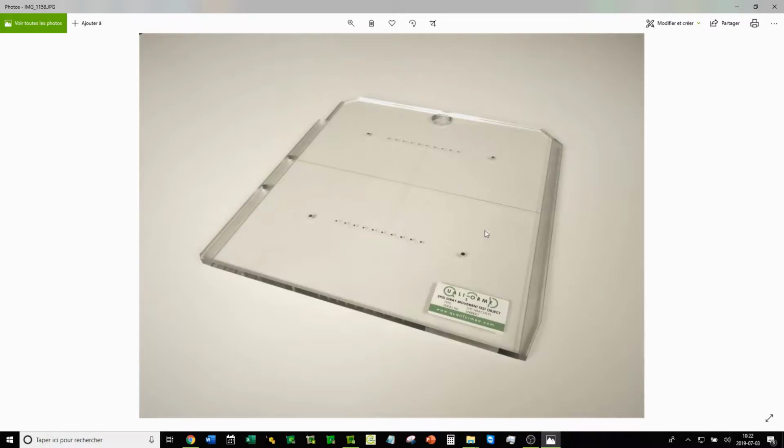The Abacus test object is a plate with embedded tungsten balls, which provide on images a reference point coming from the X-ray source. It is not used during tests, but only during the pre-test, whose purpose will be explained later on.